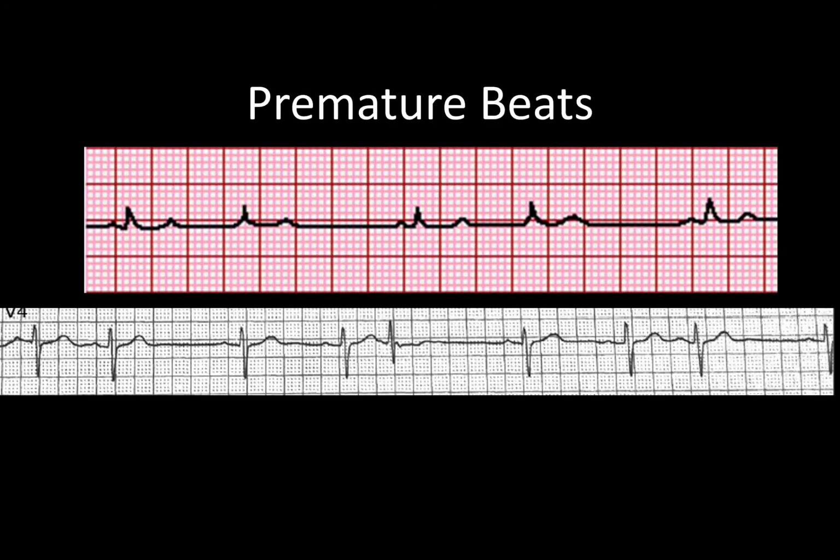Okay, so you've heard me mention it a few times already, but I'm finally actually going to sit and show you what I'm talking about. Premature beats are ectopic beats. Specifically, they're early. Now, what are a couple good examples? Without knowing the names of these, it's just the idea that I want you to see here.